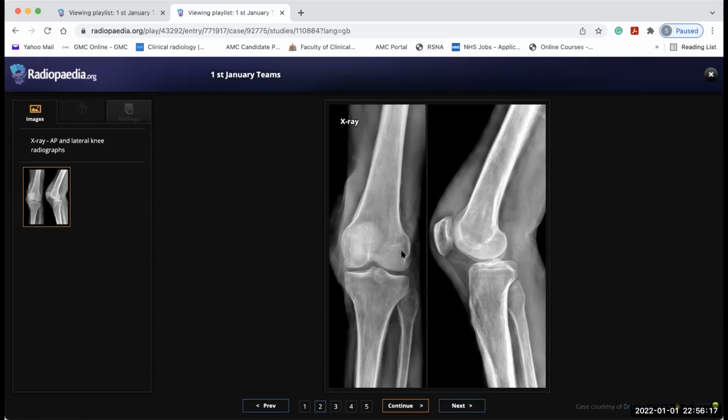Okay. So mainly you have a periosteal reaction involving the visualized bones, and you pointed out that this may happen with venous insufficiency. This is correct. So any other differential? It can be cellulitis because the skin is thickened. Yes. Okay, but cellulitis is an acute process. It will not result in periosteal reaction. Yeah. And other things?